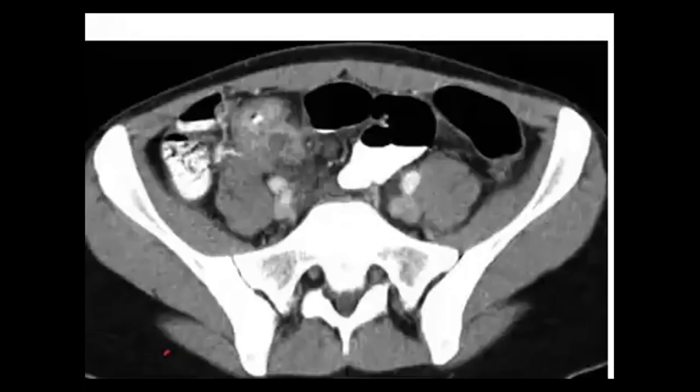So I see Muayyad now. You maybe would like to mention that again, it looks like more thickening amounting to a mass maybe, but there is fat stranding. A good negative that you should put in your description in this case: no ascites, no intra-abdominal fluid, and no gas.